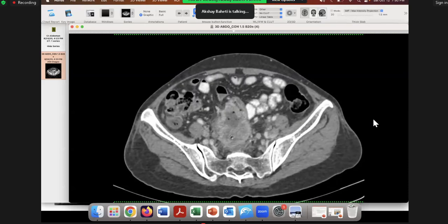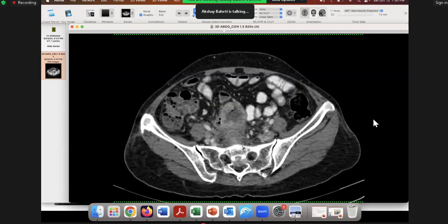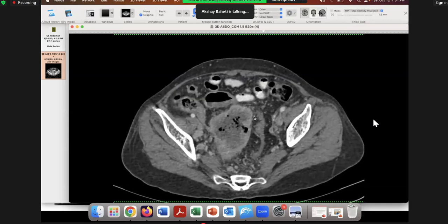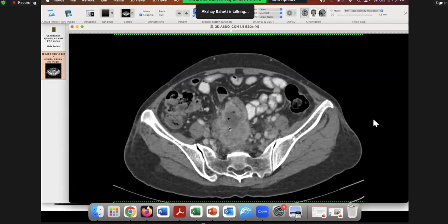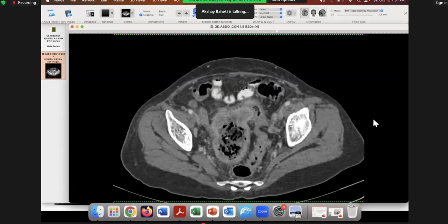Right. So this is enhancing soft tissue. Also this is soft tissue, right? This is all collection, or fluid, whatever. But this is not fluid. This is some soft tissue here, right? And even this looks pretty thickened, right? So we are not sure. We cannot rule out a mass, right? At least right now. Okay. So why is there all this gas and this weird appearance? This appearance made you think of colon, didn't it? That's why you thought this is a sigmoid mass, right?